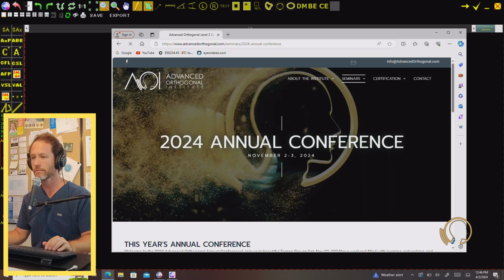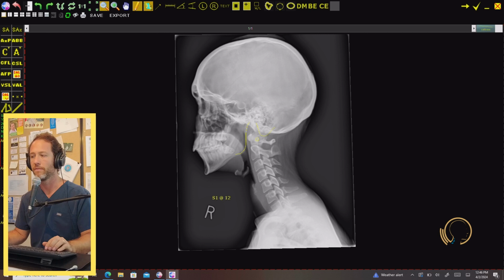So back to the view here. Sagittal film. And this time, listen, I'm really trying to make this video as beneficial for docs and students as possible. Even a quick reference for those of us who have been doing this forever. I got notes. So today, I actually printed up notes. So by way of introduction, this is the sagittal film.